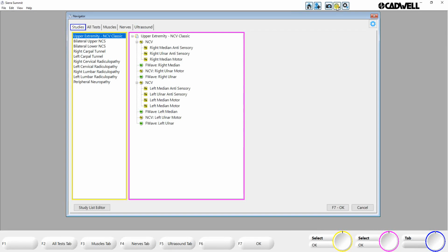In this video, I'll go over the basic functions and features in the NCV Classic software in Sierra Summit version 3.1. When you first start a new study, you'll be presented with the navigator screen, which is where you can go to select different tests and nerves and muscles, etc.